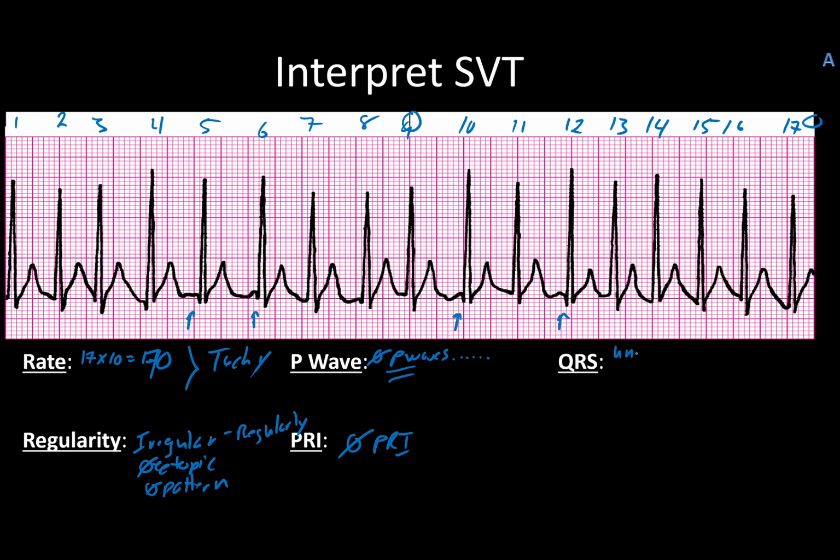The QRSs are, of course, uniform. Actually, we have a few different patterns. By and large, it looks like we have a small QRS pattern most of the time, with some variations here and there. The T waves all look pretty well uniform. They're just peaked a little bit, which is a sign of a few other different problems, but that's for another part of the lecture.